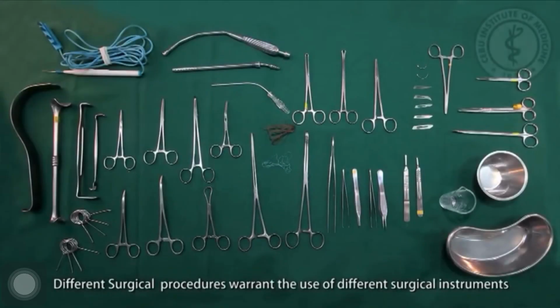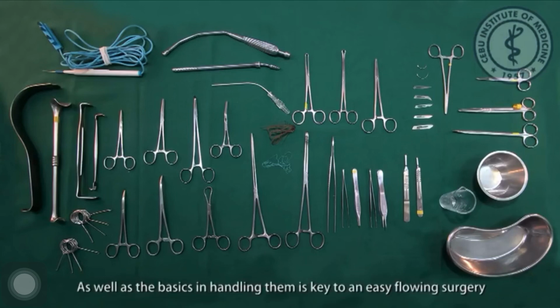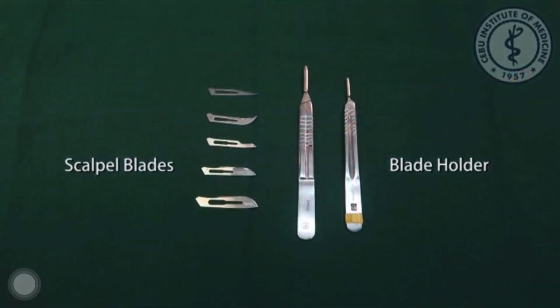Different surgical procedures warrant the use of different surgical instruments. Knowing each instrument and its functions, as well as the basics in handling them, is the key to an easy flowing surgery. Scalpel blades. Blade holder.